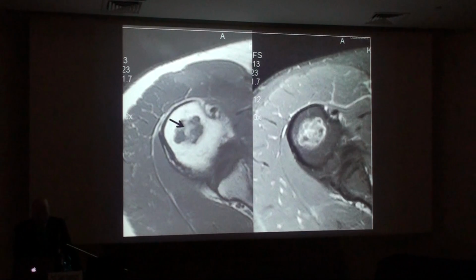There's very, very few lesions. The only other lesion that typically will have fat within it occasionally is lymphoma, as it starts in multiple locations and extends through the bone. But typically it's much larger, much more extensive than that. And this pattern with fat within it is highly characteristic of cartilage tumors. And of course, on the right, you can see that septal and peripheral pattern of enhancement around these lobules of cartilage. Again, very characteristic of an enchondroma.